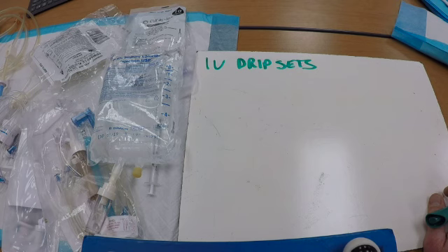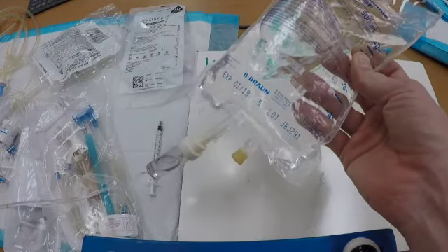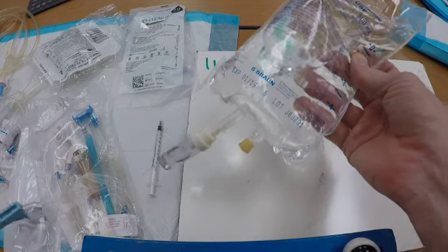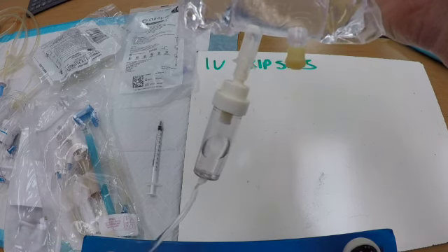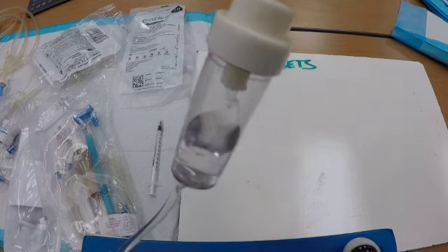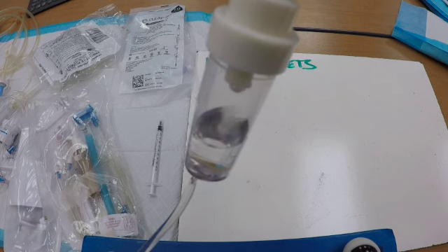So to start, when we talk about an IV drip set, we're going to talk about the tubing that connects the bag of a fluid, usually normal saline or lactated ringers, to a patient, and there's going to be this drip chamber. As you open it up, there's a clamp that I'm going to open, and you're going to see fluids flowing, and if I slow it down, you'll actually see drops.